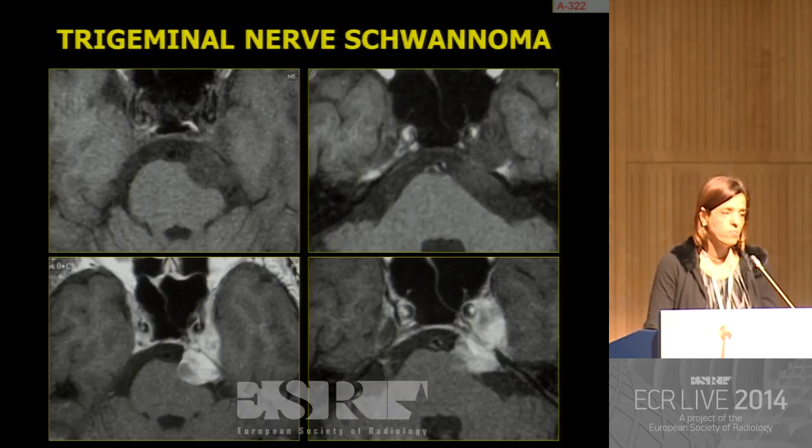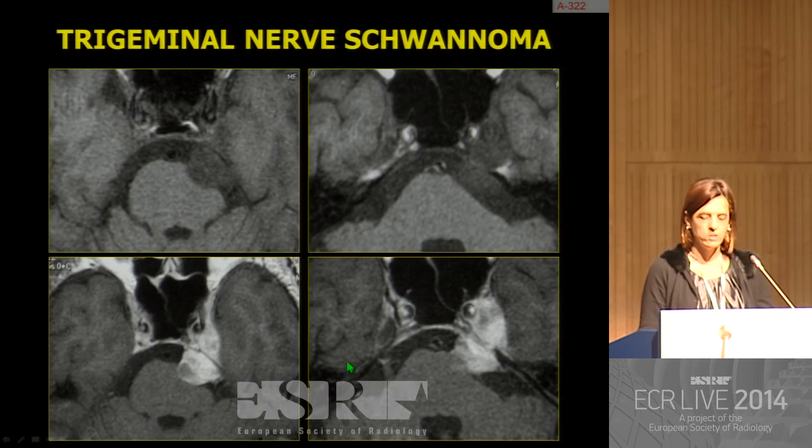As you have many neurovascular foramina in the central skull base, you always have to consider the possibility of a cranial nerve or a cranial nerve sheath tumor, and you have to know the course of cranial nerves in order to make the diagnosis of these lesions. So you see that this lesion is actually along the course of the cisternal portion of the trigeminal nerve.